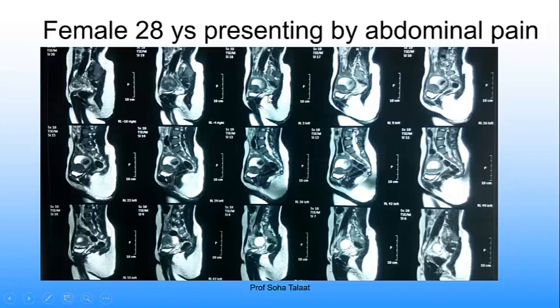This case was a diagnostic dilemma at the time. She was a 28-year-old female presenting with abdominal pain. The uterus is distended with a fluid-like structure with an echogenic structure. It appeared to me at first to be a fetus inside. I thought the patient was pregnant. She said that she's not pregnant. There is an ovarian cyst, but just a simple ovarian cyst or even a follicle. And she said that she has had menses for only 2 weeks and the pregnancy test was negative.